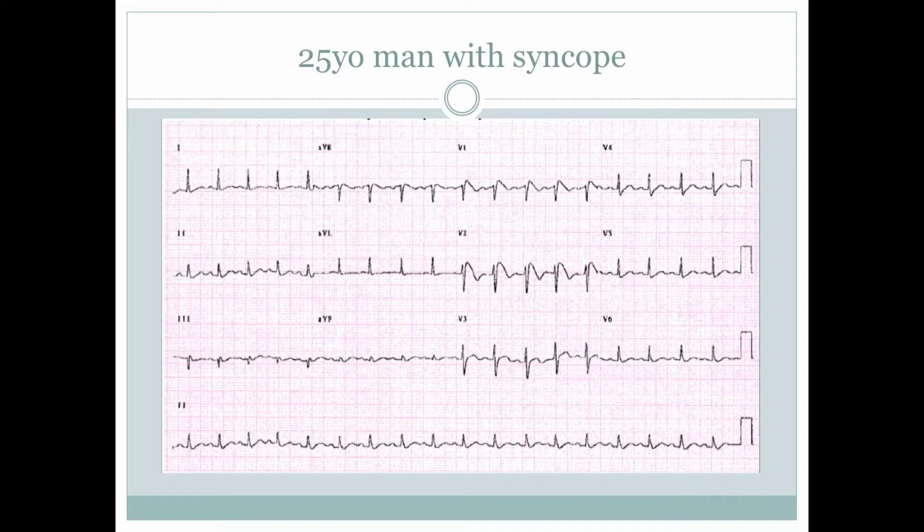So this is actually like Brugada syndrome, especially given this guy's history of syncope, and he is a pretty young gentleman, probably pretty healthy. One of the main issues that causes this constellation of symptoms, as well as this EKG, is going to be Brugada syndrome, which is a sodium channelopathy. They have ST wave changes that you can see throughout the precordial leads, and it ends up causing syncope. This is a familial issue, so the family history will probably have syncope also, and changes like this.